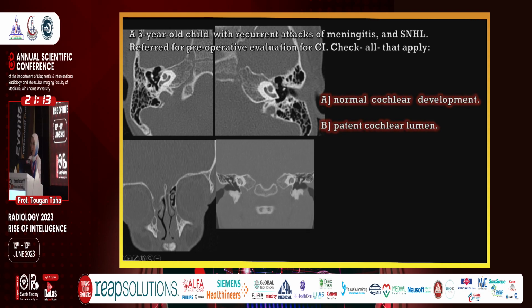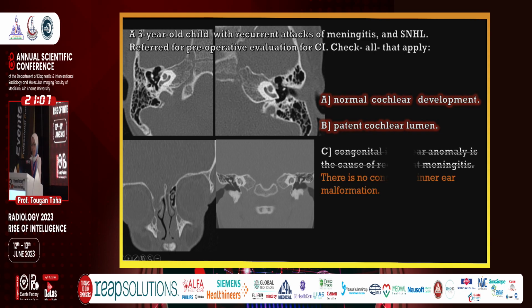The correct answers are that it is normal cochlear development and patent cochlear lumen. Sentence C is wrong as there is no congenital inner ear malformation, and sentence D is wrong as there is a significant abnormality in this study.